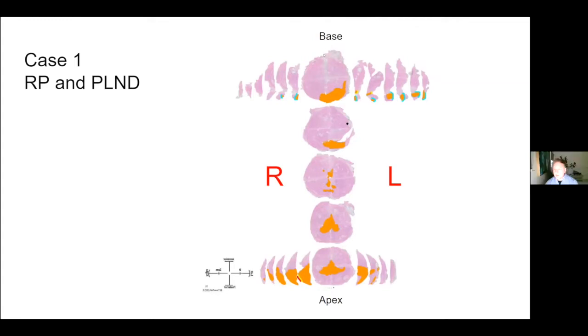So these are quadrants. You agree? These are quadrants reconstructed to show the transverse sections of the prostate, going from apex up to base, with additional parasagittal sections of the base laid out from midline through to lateral, and similarly at the apex.